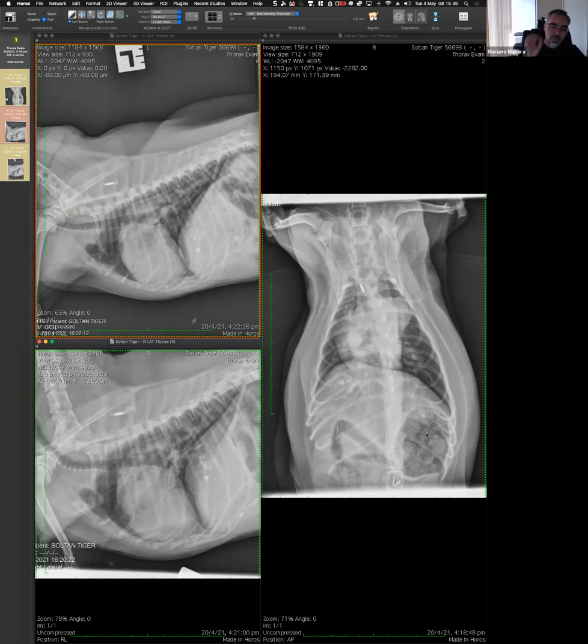Like, okay, the heart looks abnormal, but the lungs don't look supremely abnormal. So why is the dog so dyspneic? Okay. I guess the only thing that came to mind when you were talking about this is that it all depends on your expectation. Makes sense? It doesn't call my attention, like a super dyspneic dog and a super normal radiograph. So for me, it's not really shocking me. That's a very common situation.